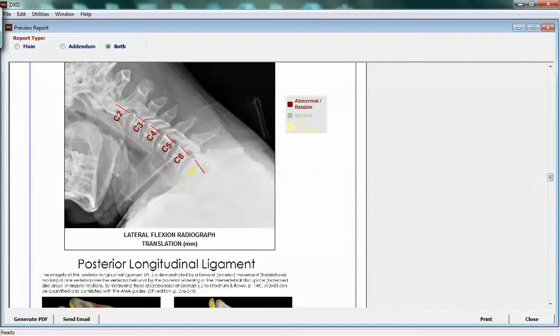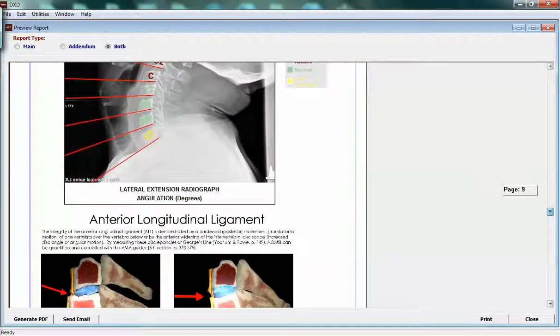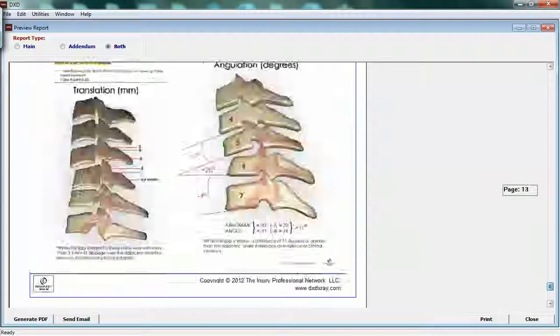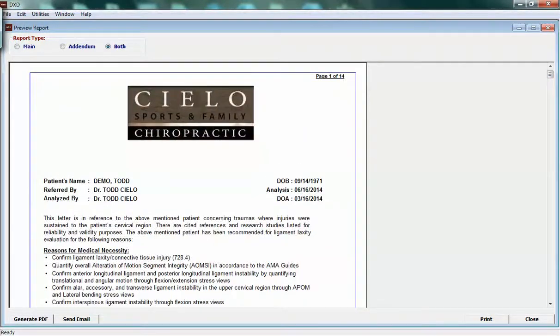And then you always look at George's line. You see how smooth George's line is here? It's always in the same direction. You're looking to make sure that you hit the bottom of these end plates. Again, you're looking for the smoothness of George's line all the way down. So please consult this when you're having questions about plotting of the points.